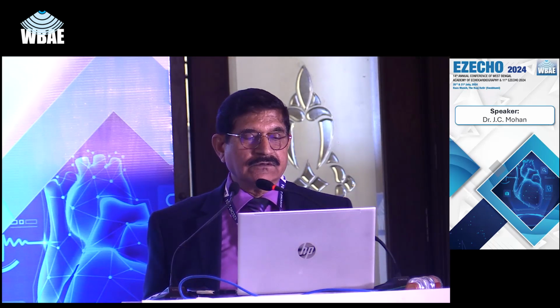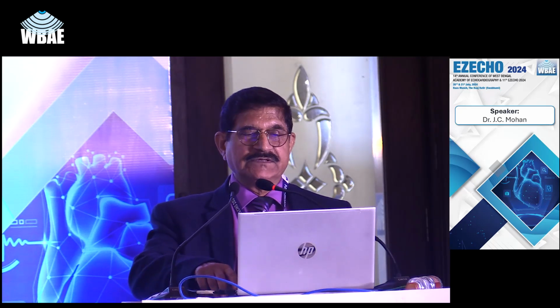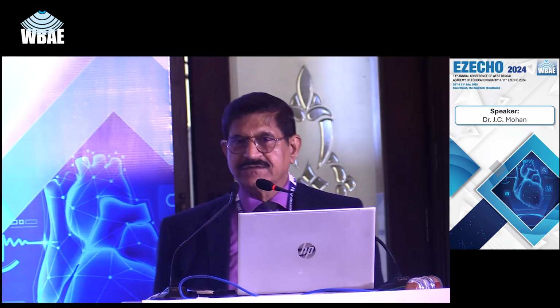But here, for some reason, we can skip this thing. Let us see if we have some frozen pictures. Some funny thing is happening, but anyhow, these are T2 weighted images. Okay, look at the left image.